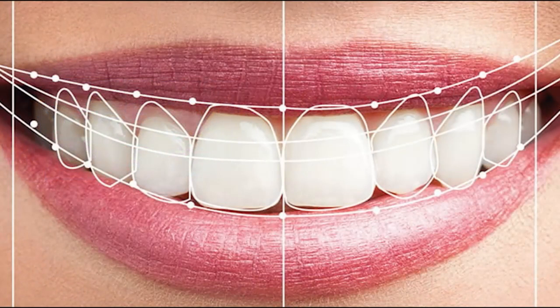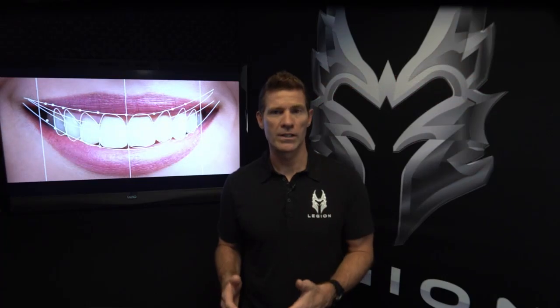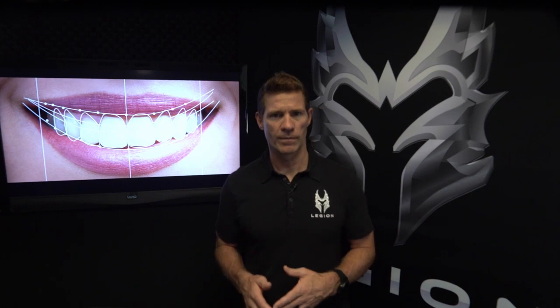Okay. Now, I'm looking at the proportions of the teeth, the length-to-width ratios, the golden proportions, and the angulation. Now I look to see if there's crowding, are there angulation or rotational issues? We can also visualize the midline easily to determine if teeth need to be moved prior to treatment, or if they can be visually moved using restorative dental procedures.